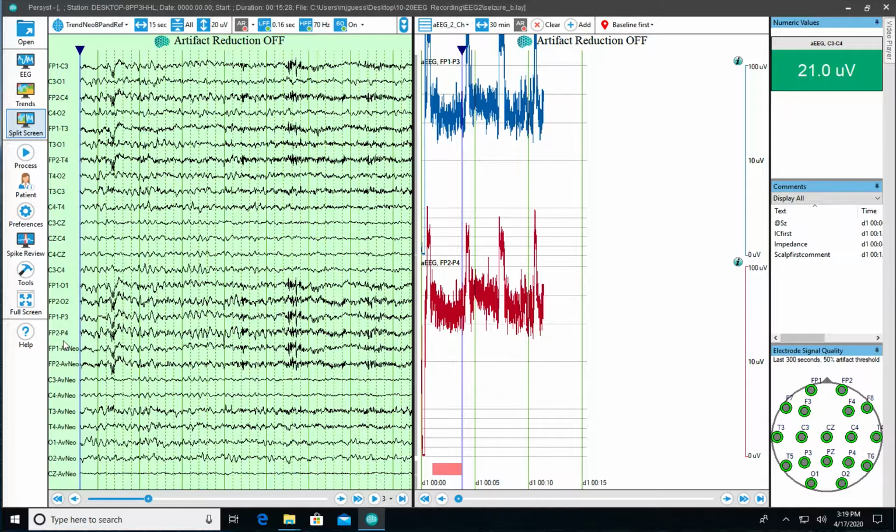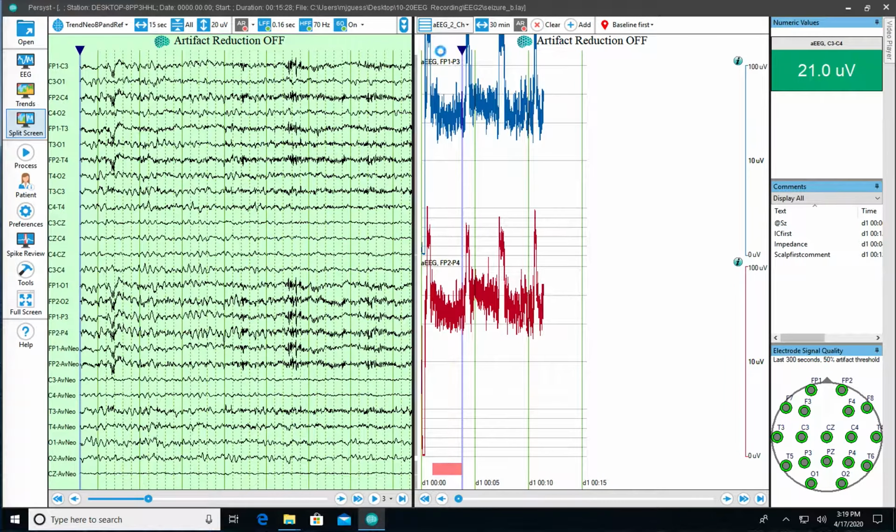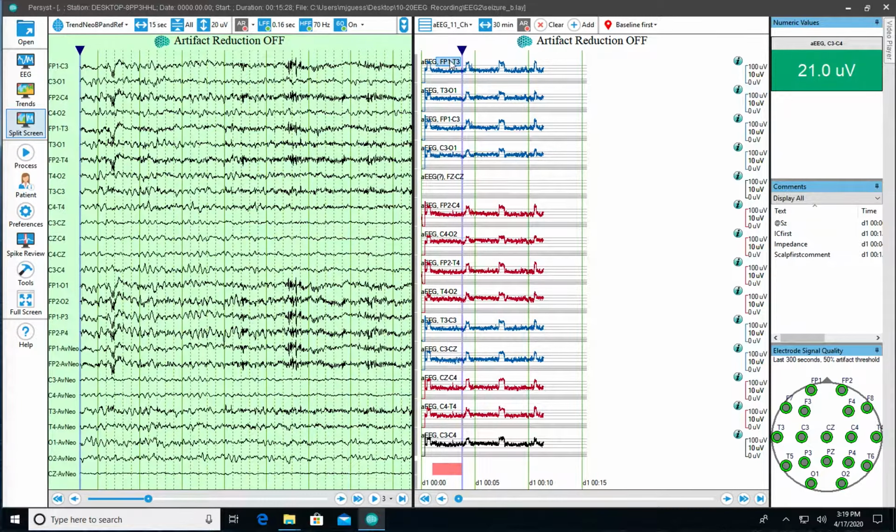If we may be using those 2 channels and then may go to a full double distance neonatal application for some patients, it's there. You can just switch the trend panel. You don't have to reconfigure. And at the bedside, you could have a simple 2-channel aEEG, even if it has the additional electrodes, and then for review, you can have the additional channels available for that. That is the rationale for doing it.